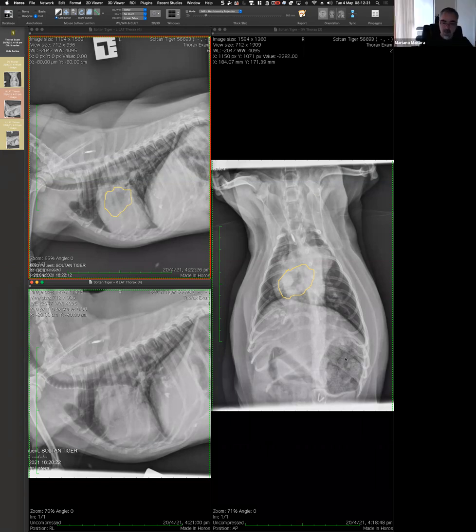Okay. So you are kind of expanding on this idea that there is something abnormal. Correct me if I'm wrong, I think we are all agreeing that it's likely in the mediastinum, or not. Let's even go further away and say there is something abnormal somewhere around the heart.